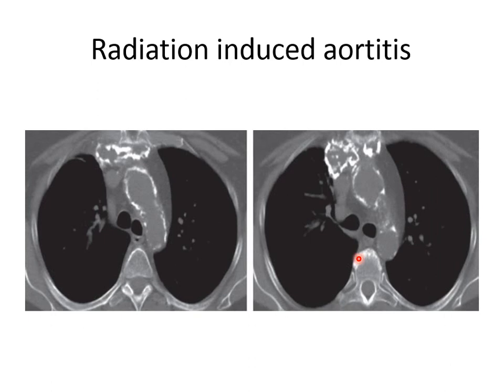Another topic is radiation-induced aortitis. Radiation causes inflammation of the wall of the aorta, and in a late stage many things like thrombosis, stenosis, and calcification. Mainly we think of it if we see a young patient with calcification in the proximal coronary arteries and ascending aorta. So we may think that he had mediastinal lymphoma treated, causing accelerated atherosclerosis and calcification of the aortic wall.